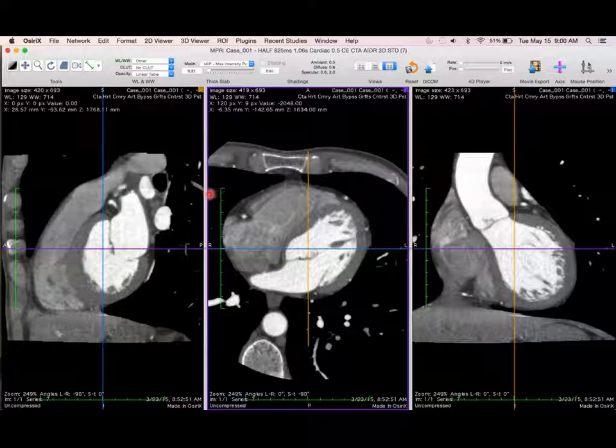So you get basically a very nice three-dimensional volume, and you have to investigate that volume in some way. It's almost, in some ways, too much data, right? This is the thing you're familiar with, those of you using either Horos or Osirix, where you can look at different planes simultaneously. It's called multiplanar reconstruction. The yellow line here represents this image as I cut down here, and the blue line represents this image in the coronal plane.